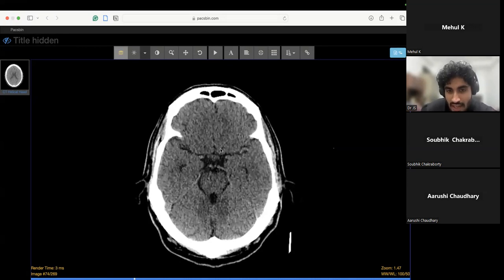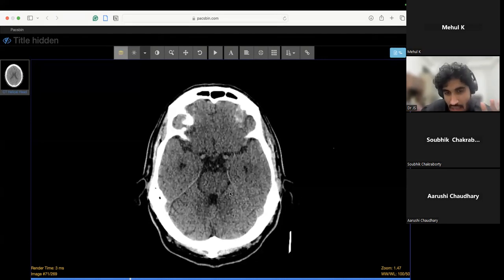So this is our star here. You can see the star here, a large star. Usually this is where the circle of Willis will also be present. So this is our star here, the black color star. Mickey Mouse is smiling, and it is in a black, ambient environment.